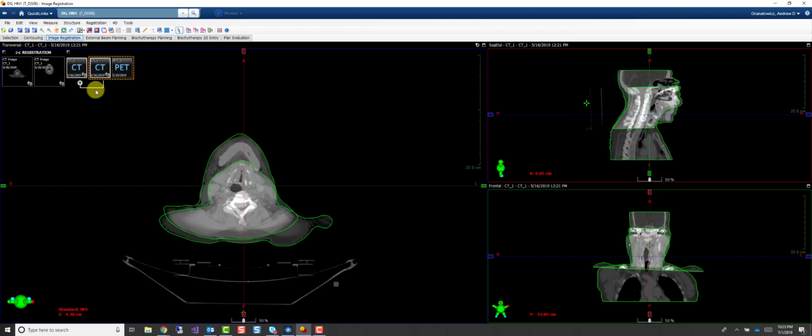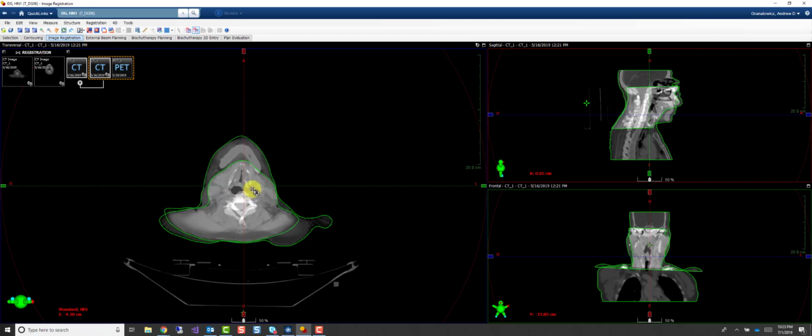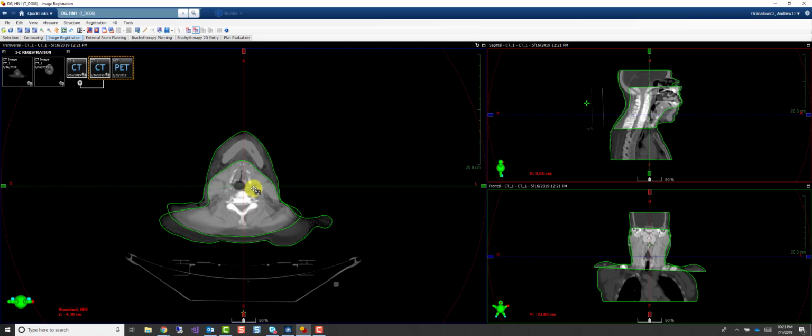If you want to edit that fusion after the fact, we would just come up here and click manual match. It opens up our options again, and we can continue to make edits. If you want to delete a fusion, you can right click on this line, and we need to get out of the edit options. So right click and delete.